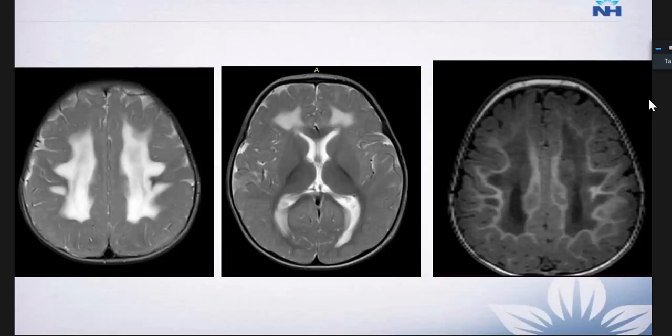On the MRI images, first of all you have to assess whether myelination is normal for that age. What you are seeing are confluent areas of white matter abnormality which are symmetrical in nature, more in the periventricular and deep white matter on either side. This is the image at the level of the basal ganglia and thalami, which look normal. The hyperintensity on T2 weighted is markedly bright, almost identical to the CSF signal intensity in the lateral ventricle.